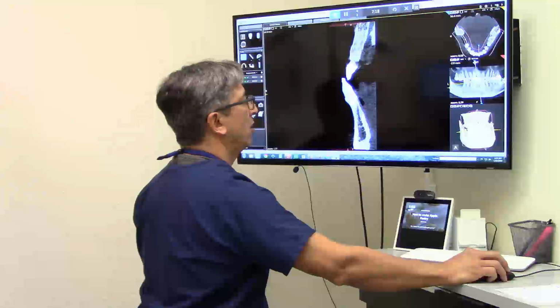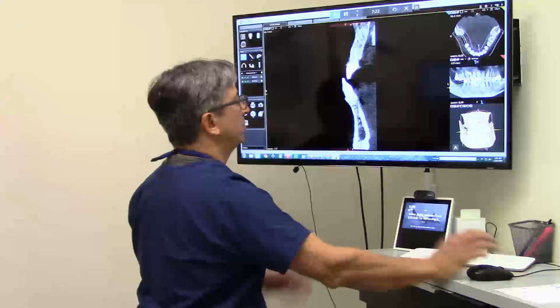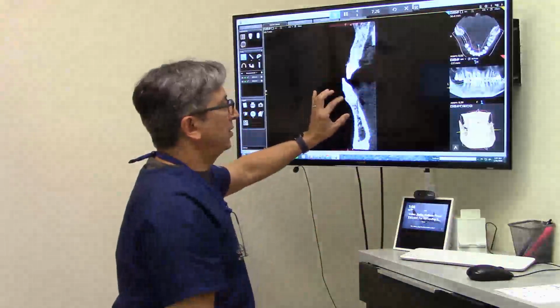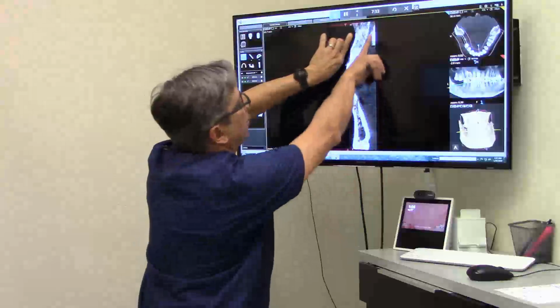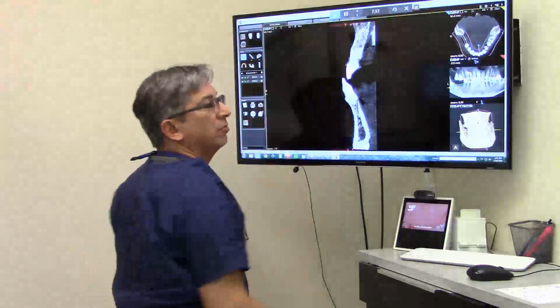on the lower. And now you can really see what I'm talking about in terms of what's really constricting, it becomes very narrow. Your implant has to stay at the top of the bone, but then it becomes narrow where we actually need to go wider. And up here you can see how it becomes pretty parallel, and really you have to make sure you nail that bone.